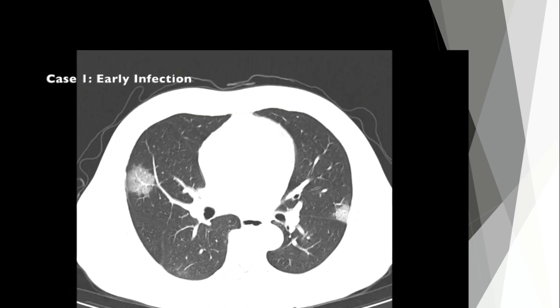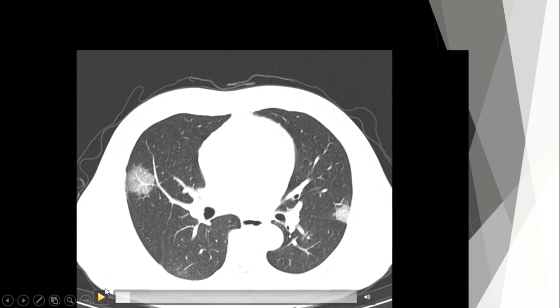So early on in COVID-19, usually in about the first 4 days or so, you classically are going to see a bilateral process with... Here we see actually ground glass opacities because you see the difference in the density of lung and our part of atypical pneumonia, but you can see the vessels through this slightly lighter part of the lung.